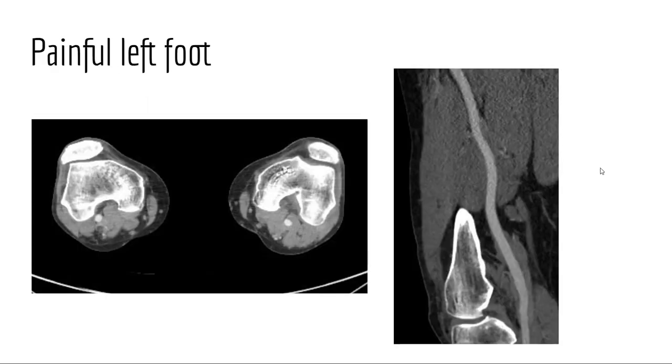External compression, these are fun. These are typically in healthy patients. I remember this was I think a 32-year-old guy with a painful left foot. And if you can see very subtly, there's flattening of this popliteal artery. And this is the so-called popliteal entrapment syndrome, typically from a hypertrophied medial gastrocnemius tendon. Very interesting case, very subtle.